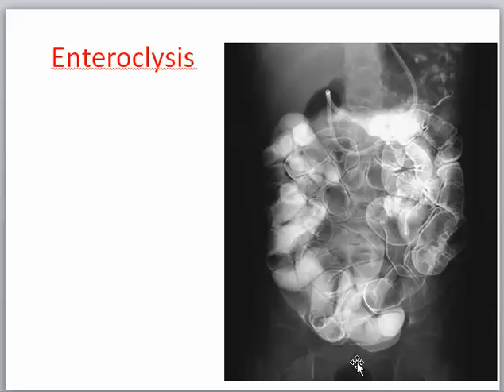It is visualization of the small intestine by dilute contrast while it is distensible, starting using a catheter and injection of any drug causing hypotonia of the small intestine, and thus dilatation, and you will get such an appearance, enteroclysis.